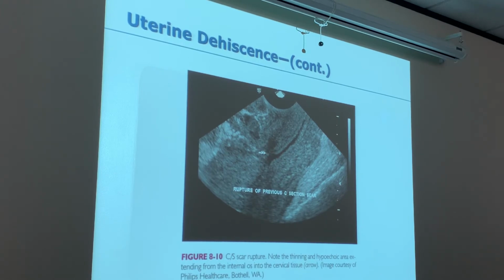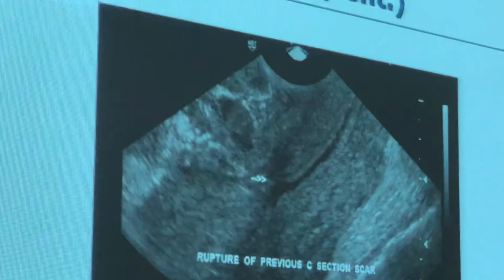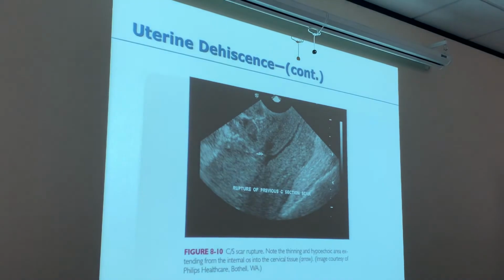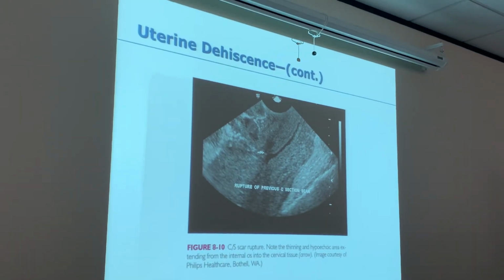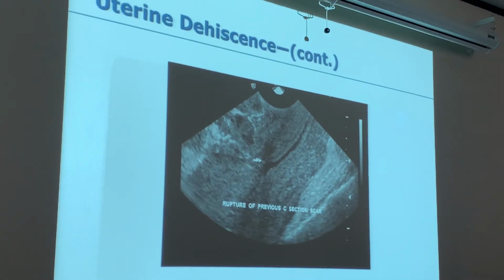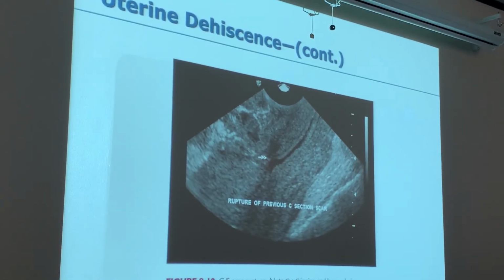Anytime, no matter where you're looking at in the body, if you have a triangular defect, it's abnormal. Okay? You can see it at the cervix, the lower uterine segment, and the endometrium. If you see that little triangle here, then you have something in the endometrium. If you have it up here near the chest, you have a pleural effusion.